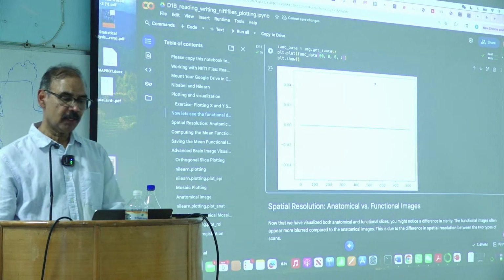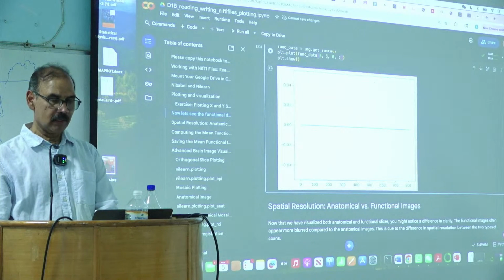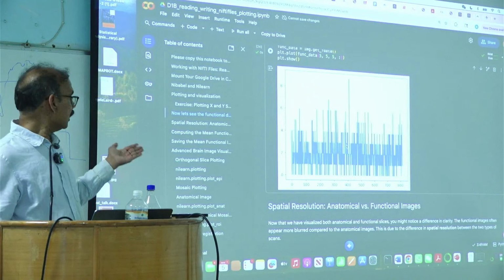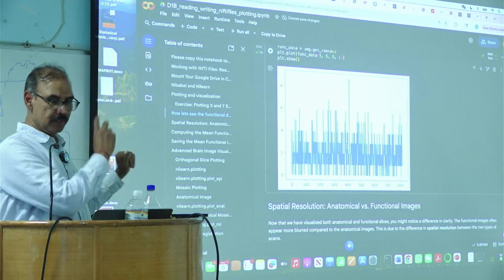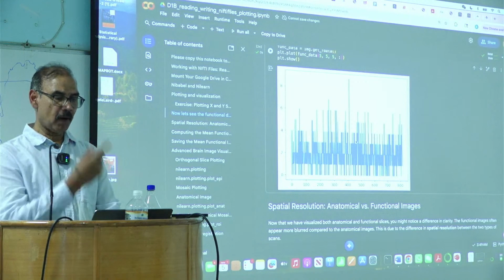The other thing we can do is go closer, right? This is still out. My guess is it would be outside. So this is like the scanner noise, okay? So there is signal, but it's noisy, right? So this is from outside the brain.